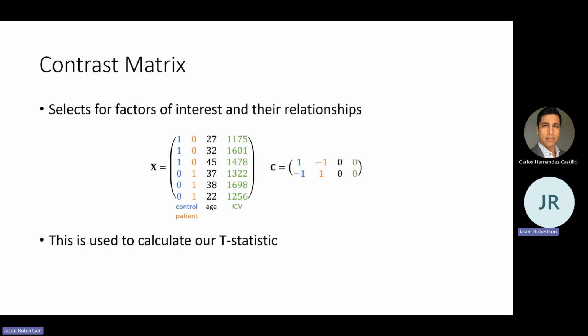So here, this contrast is where you specify what output you want from your comparison. This is not the model. The model is already created. It's the first step. Everything is calculated. You have all the data for every variable, but the contrast is where I say, okay, I want to do some comparisons.